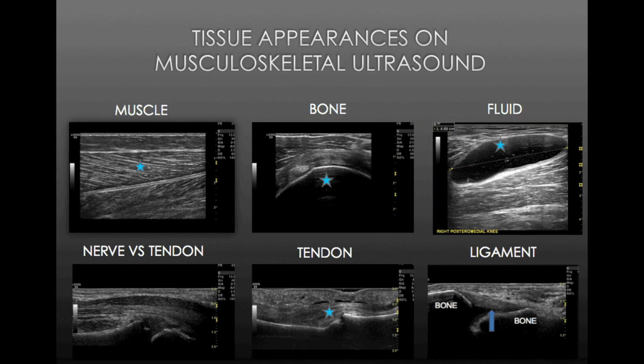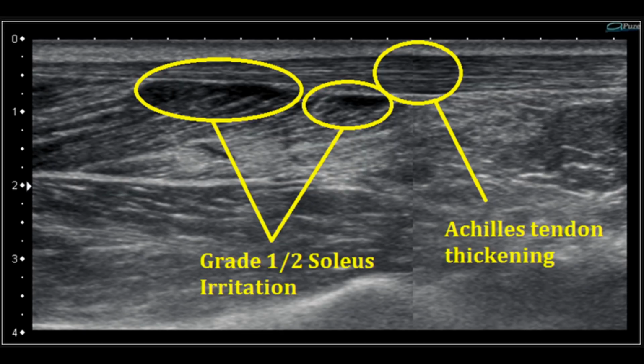Okay, let's flex our humor muscles and explore the world of musculoskeletal ultrasounds, where we get to be body part detectives. When we're looking at tendons, they should have a nice striped pattern, kind of like a well-organized zebra. If we spot a dark gap in that pattern, it's like a rip in the zebra's stripes, and that likely means a tear. If the tendon is swollen and looks darker overall, it's probably tendinitis, which is like the tendon is throwing a tantrum and getting all red and puffy.